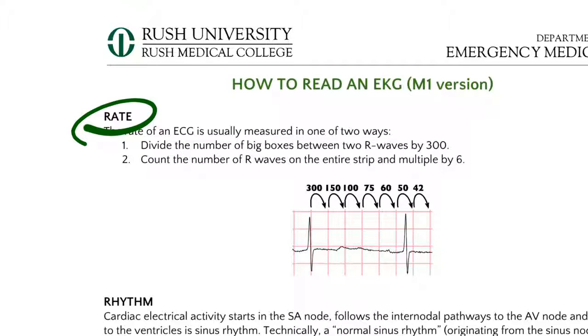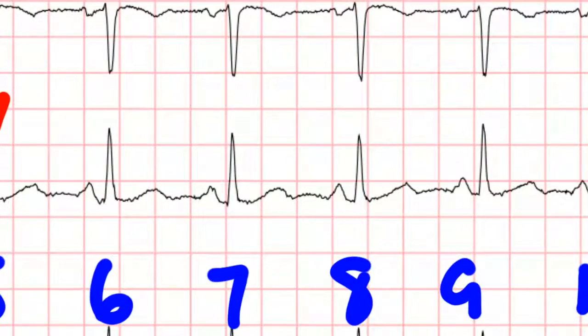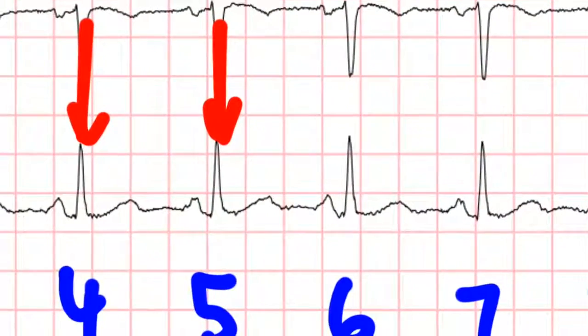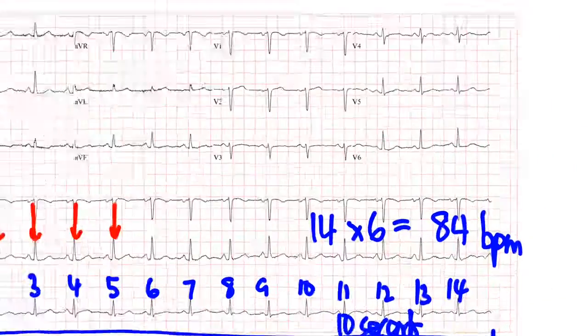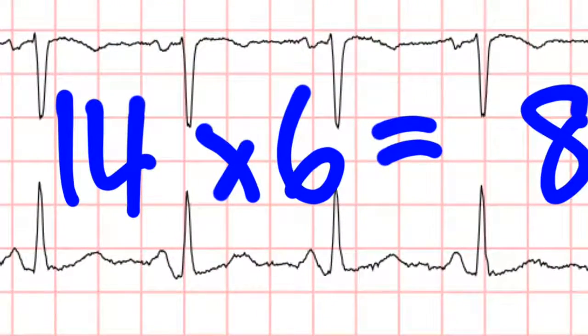Let's go to that initial EKG we looked at. Let's zoom in real close here and do the same thing. Let's find a beat that falls on one of those lines. I'm sorry if I'm giving you vertigo here. Here we go, this one does. Right here. I'm going to use a red color.